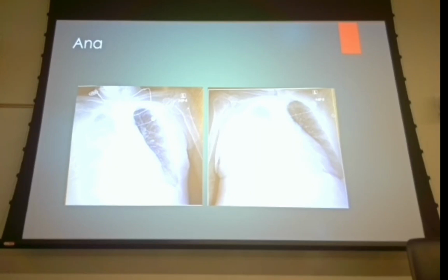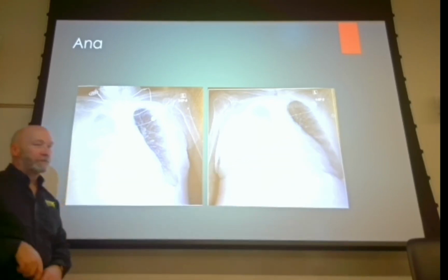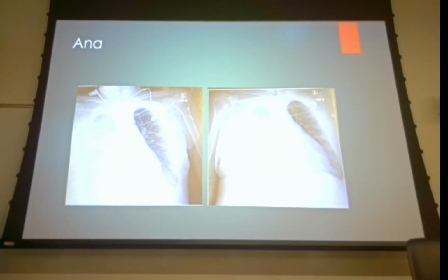You looking at it? All you got to do is say it. Here's the right side. What's that? Where's the right side? Well, where is the right side? That's a good question. Maybe another massive pleural effusion. Also, though, where is the left side? There's a lot the matter with this one.